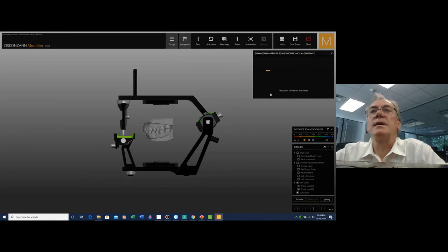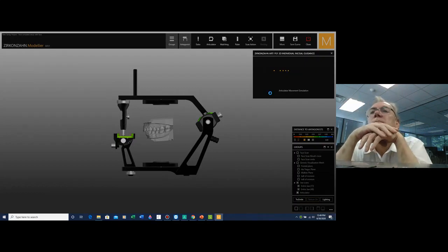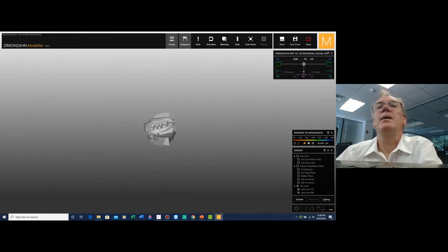It just takes a while to calculate. Okay, now we have it active.